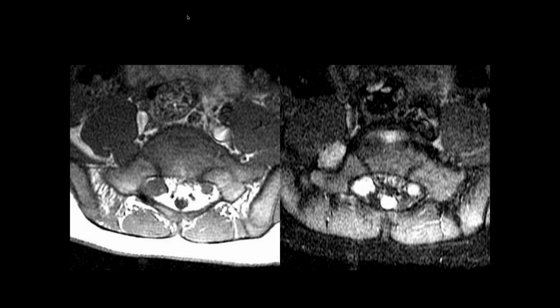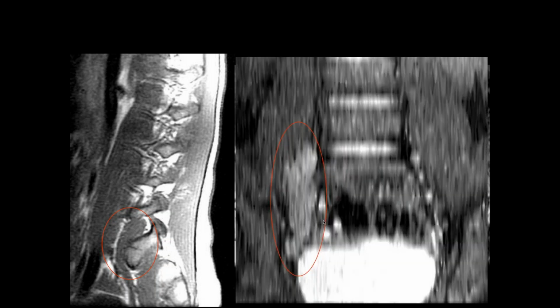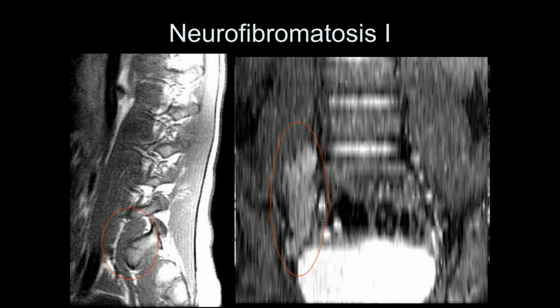Okay. So we have, looks like very large nerve roots or fluid around the nerve roots, exiting nerve roots, yeah. Okay. And it's extending beyond the neural foramen, so I'm thinking of some nerve tissue tumor, like multiple. Yeah, looks like a nerve tumor, like schwannoma. What is this? Is it like neurofibromatosis, like plexiform? It's not really plexiform. Okay. These are neurofibroma. Neurofibromatosis, right? And typically they'll have enlarged foramina because it's something that's been there a long time, so the bone is remodeled around it.